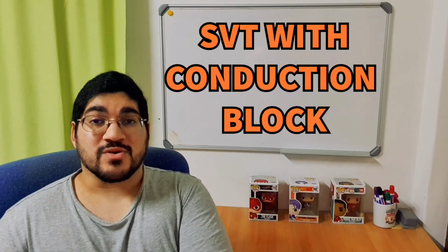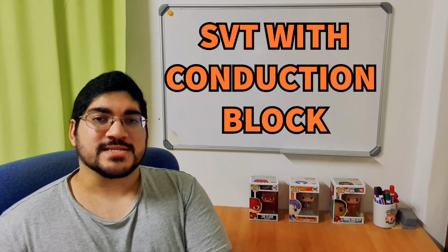The third one is if you get a supraventricular tachycardia with a conduction block. What that means is if you've got a supraventricular tachycardia, so it would normally be narrow complex, but you've got a conduction block, like a bundle branch block or something like that, then that complex shifts from being narrow to wide because of the conduction defect. But the impulse is still being generated in the atria. So if you see a bundle branch block or something like that, but a P wave that looks like it's generated in the atria, then you may see an SVT with a conduction block.